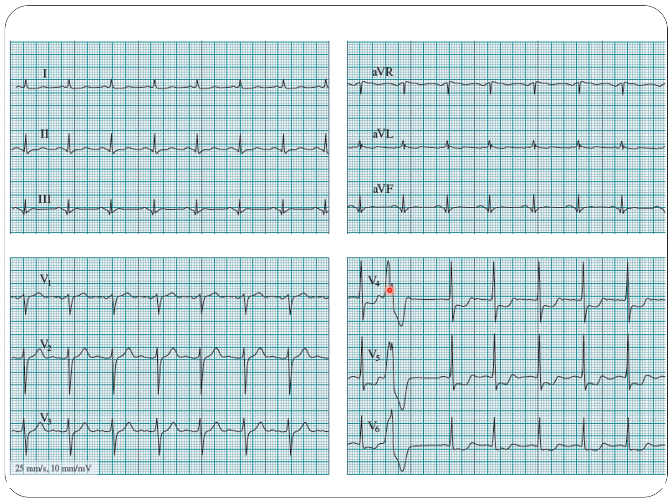A ventricular premature beat is compensated, meaning that this distance should be equal to this distance. Let's count the squares. 1, 2, 3, 4, 5, 6, 7. Here 1, 2, 3, 4, 5, 6, 7. Yes, that's a compensated ventricular beat.